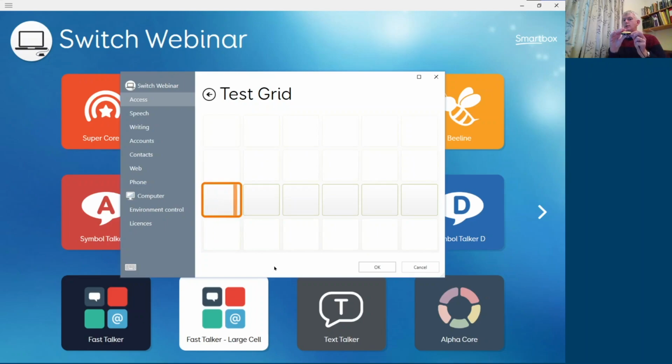Okay, I want to wake somebody up, call for someone's attention. I'm going to long hold my switch. Okay, and you heard the sound being played. So, where that really might be helpful, it can be useful to set off an alarm sound. But the other way to think about it is there are commands in the grid, for example, to send an instant text message. So you could add a command that says, send an instant text message that says, help now, whenever I do my long hold.